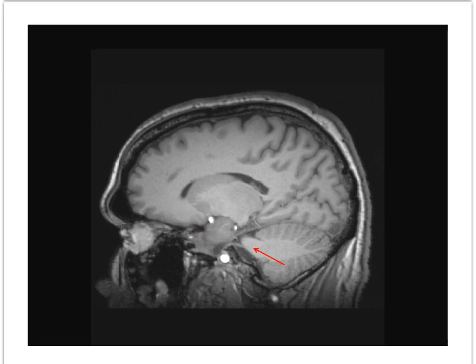This arrow indicates the lateral portion of the middle cerebellar peduncle, and this structure extending from the anterolateral pons is the trigeminal nerve, and the arrow in front of that indicates the fluid-filled Meckel's cave into which the trigeminal nerve extends.